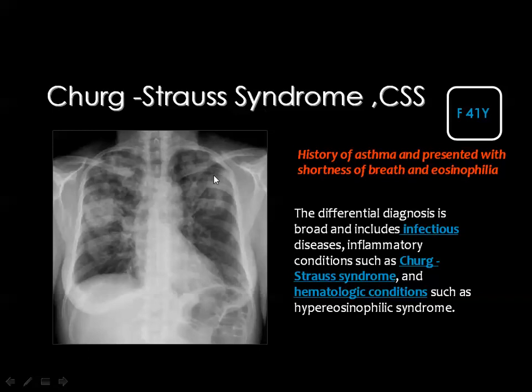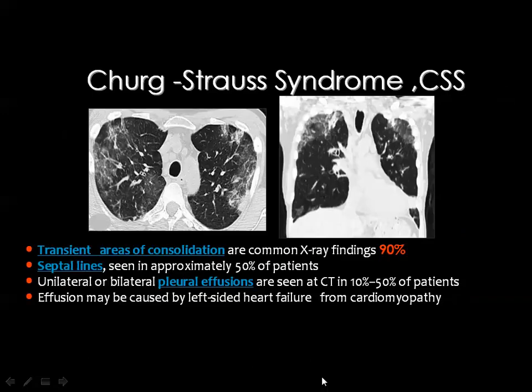And if you look here and you see patchy areas scattered throughout the lung, if you know that this patient had Churg-Strauss syndrome, then you think of one of two, exactly like Wegener granulomatosis. Either this is infection or hemorrhage. Then, in absence of the clinical data to support infection, you should consider these as pulmonary areas of hemorrhage.